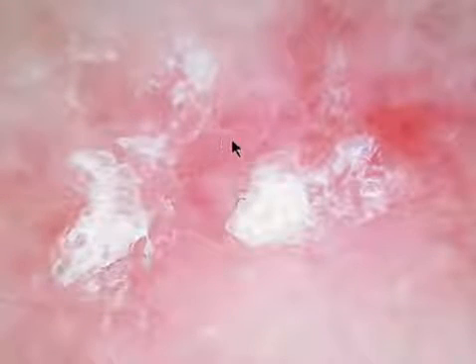And here are some examples. The clinical first. It's a clinical image of an unpigmented, slightly elevated plaque. It's scaling, and here's the dermatoscopy. What type of vessels do you see? Well, you see only one type, and these vessels are dots. Here, here, here, here, dotted vessels. So this is a monomorphous vascular pattern that consists of vessels as dots only.